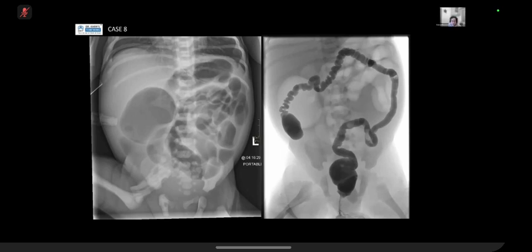Yeah, so you're right. This is one of ileal atresia, and it's often very hard to tell if this is an ileal atresia or a meconium ileus, because the main difference is that in one you can see the meconium plug, the meconium in the terminal ileum, and in the other you cannot. But as I said, it really depends on whether you can reflux contrast back into the terminal ileum. If you've got a competent ileocecal valve, then it can be very difficult. And this is one of ileal atresia. Often you can only make this distinction when the surgeons have gone in surgically.